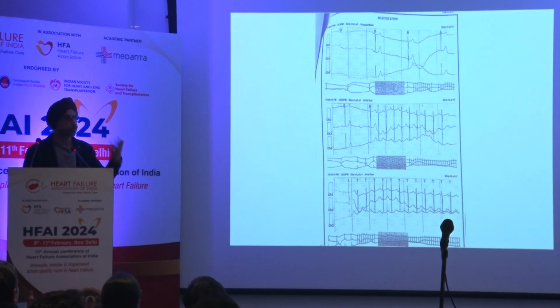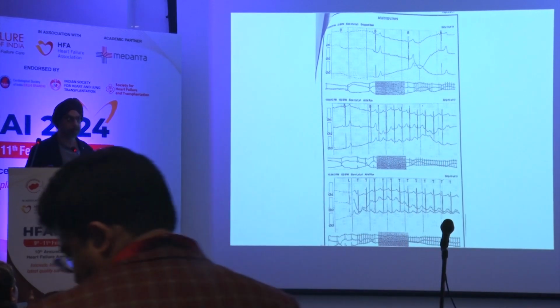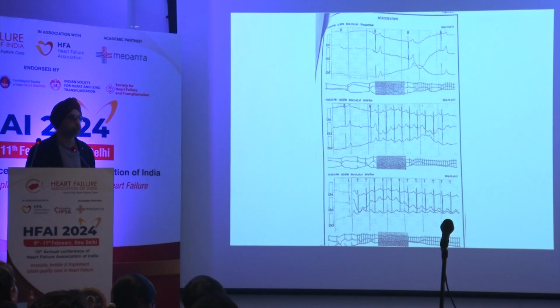But when it happens, it causes severe syncope. And it's a very interesting condition that even if you give VVI pacing to these patients, it's enough because they don't need too much pacing. But the classical thing is that you have a PP which is not too long. That means the sinus is not so slow, but the block has happened. So it is unlikely to be a vagal reaction. This is typical of a paroxysmal AV block.